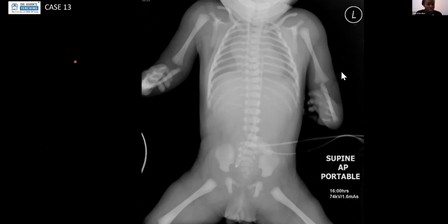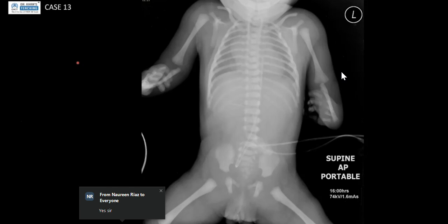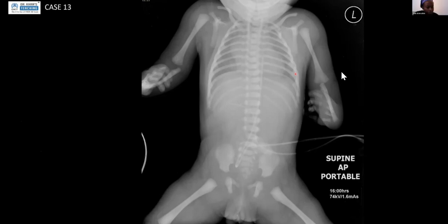catheter and the umbilical venous catheter, for those who don't know in the audience? The umbilical arterial catheter should be seen in the aorta. There are two positions, a high level and a lower level. High level should usually be above T10. The lower level should be just below the L3 vertebral level, to be away from the renal arteries origin. For the umbilical venous catheter, it should be adjusted to go to the junction of the inferior vena cava and the right atrium.